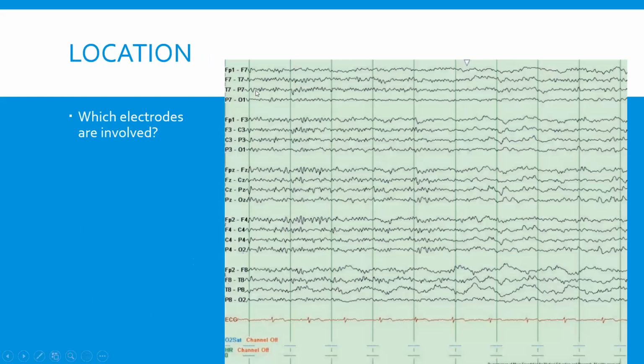Okay, so here, with the EEG, we also talk about location. On this page, you can see all the electrodes look pretty much similar, except here, right? So T8. Remember, 8 is a big number, and 8 is also an even number. So this is the right side, and it's more on the outer side of the brain, the temporal lobe.